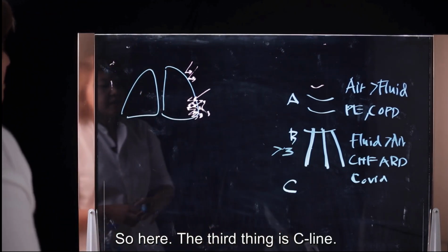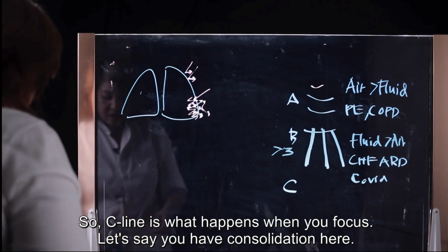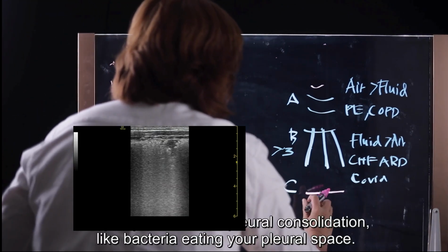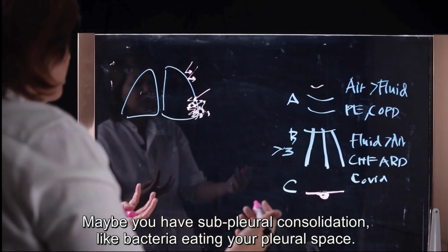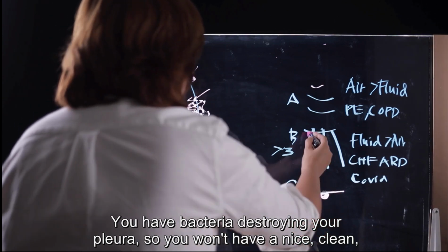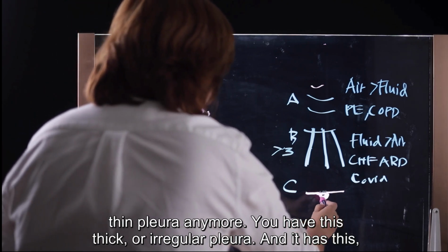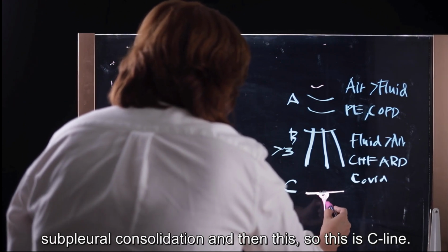The third thing is C line. C line is what happens when you have consolidation here. You have the pleural line here, and then you have subpleural consolidation because you have bacteria that eat your pleura, that destroy your pleura. So you don't have a nice, clean, thin pleura anymore. You have a thick or irregular pleura, and it has this subpleural consolidation. So this is C line.